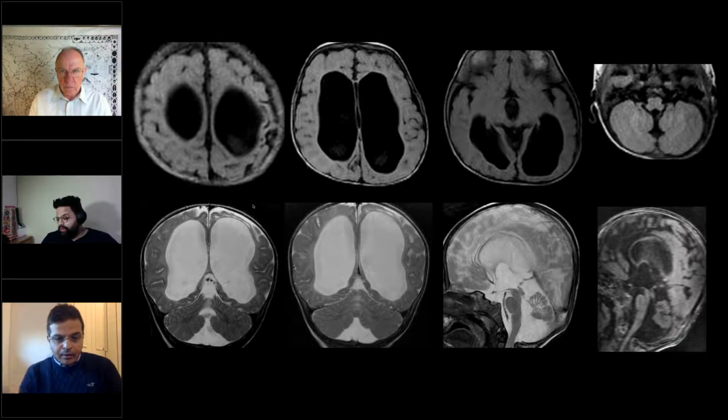To me, the vermis changes can be explained very well, just like Nihal has said. I think there is enough gliosis in that little rim of white matter that you see on the left side on that coronal below to tell us that there was extensive injury with relative sparing of the brainstem. That's why they're alive.